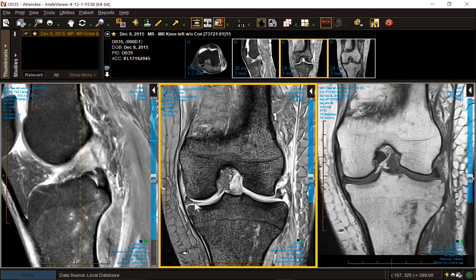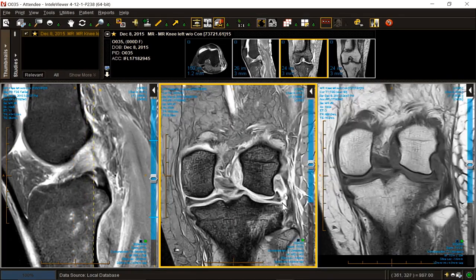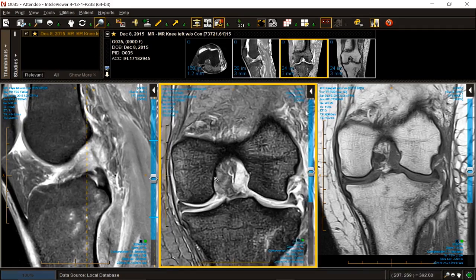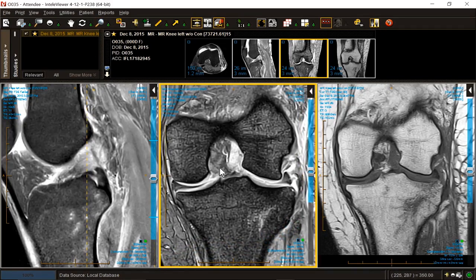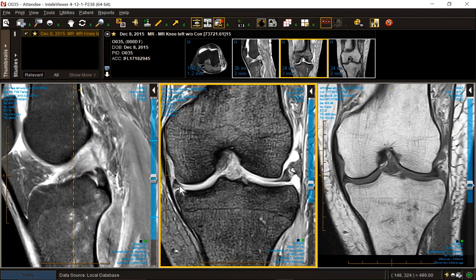In other words, is it open to the articular surface? Well, certainly on the medial side, it goes into the inner third. On the lateral side, not so much. Let's blow it up. Are we going to go in and do a meniscectomy in a 54-year-old lady for this? Never. Never. So we have to use terms that properly sequester this signal for the clinician and for other radiologists.